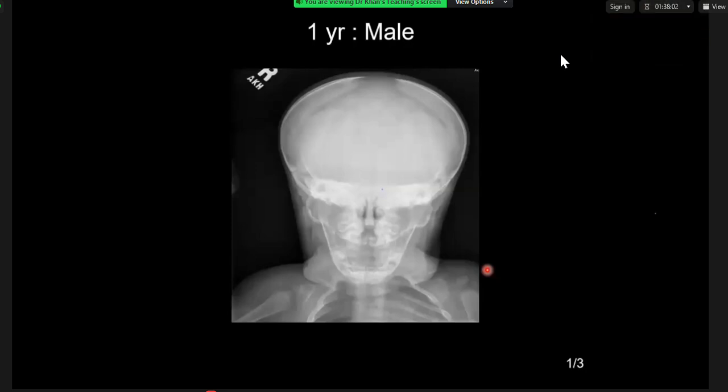Yeah, the chest wall seems abnormal too. I was asking about anything else in the differential diagnosis from the congenital world. I don't have anything on my mind.